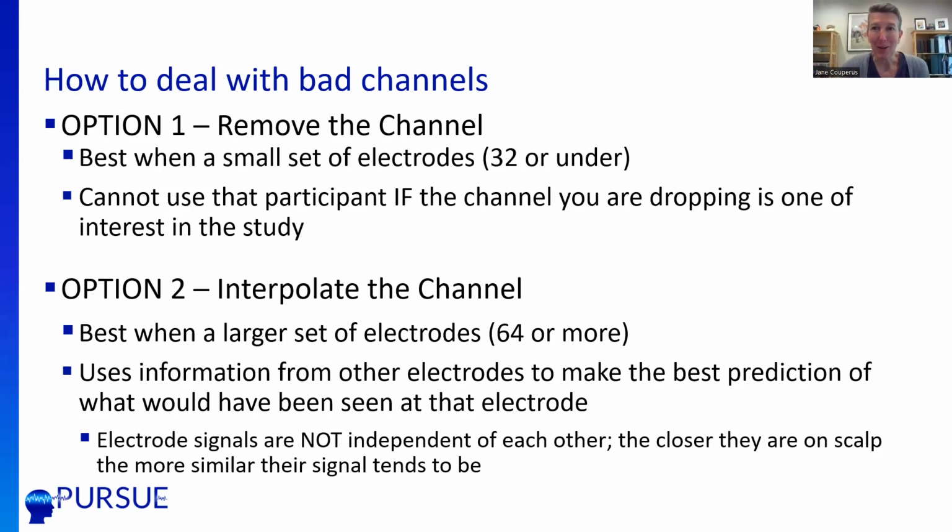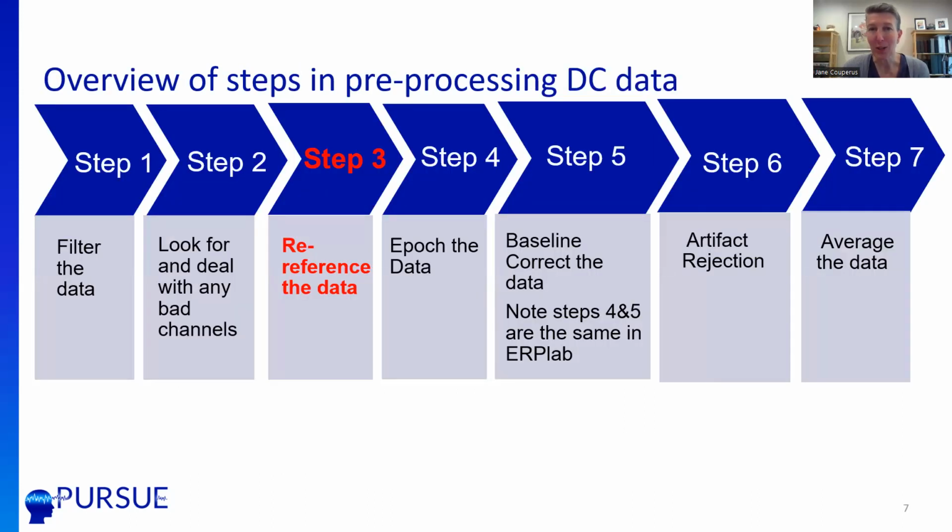For the purposes of today and our practical aspect, we're just going to be identifying those bad electrodes. I'm not going to be showing you how to interpolate, as that's a little bit more advanced. After we do this, we're going to move on to re-referencing the data.